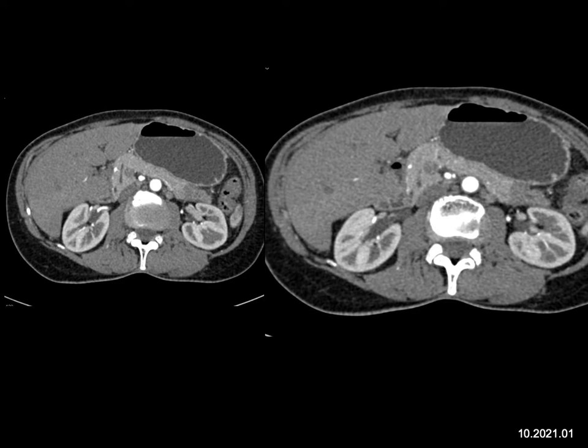be very, very unusual. I know I'm thinking about tumor, but the thing I also need to think about is autoimmune pancreatitis. We are seeing more cases of autoimmune pancreatitis, typically with elevated IgG4 levels. The reason I chose this case is that it can look very similar to cancer. When it involves the entire gland with a cigar shape, without a dilated pancreatic duct, it's much easier of a diagnosis. But autoimmune pancreatitis can be a really difficult diagnosis.